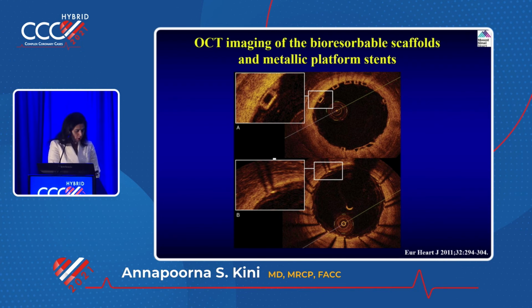Do you know what is it on the top? Once upon a time, we used to use this bioabsorbable scaffold, huge, like bricks. But this is how the normal stent will look like, once you stent it. You see the difference?